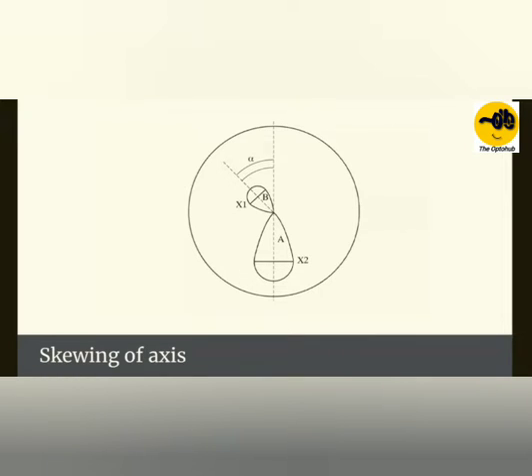So whenever you see a skewing of axis of more than 21 degrees, you start suspecting keratoconus or maybe some other ectatic disorders. Again, this can be symmetric or asymmetric in nature. In this case, what we are looking at is an asymmetric bow tie with skewing of axis, and it is an inferior steep pattern.